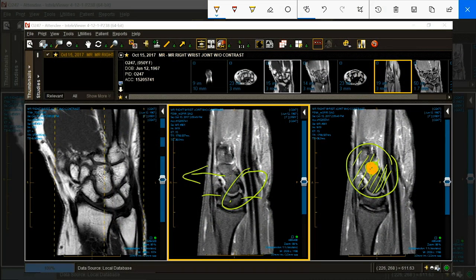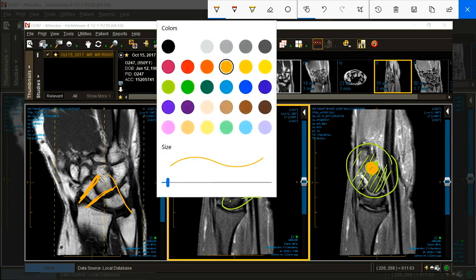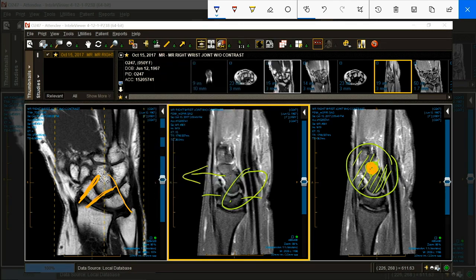There are these long ligaments, and here's that other long one. So this is the volar aspect of the wrist. This would be a radioscaphocapitate ligament. This would be your radio-lunato-triquetral ligament. Then there happen to be some short inverted V's that you're going to see with high resolution. Don't pay much attention to those right now. So you have another little baby V.